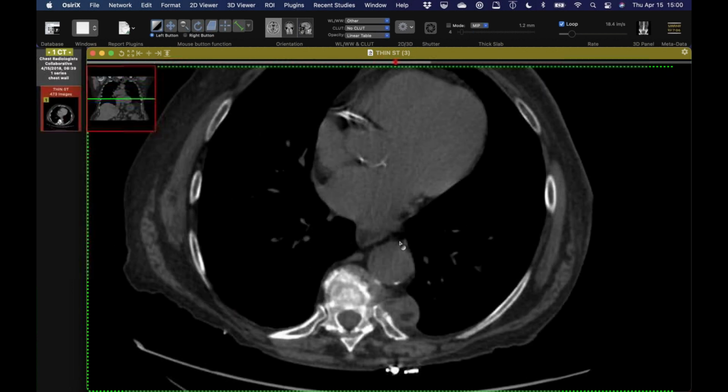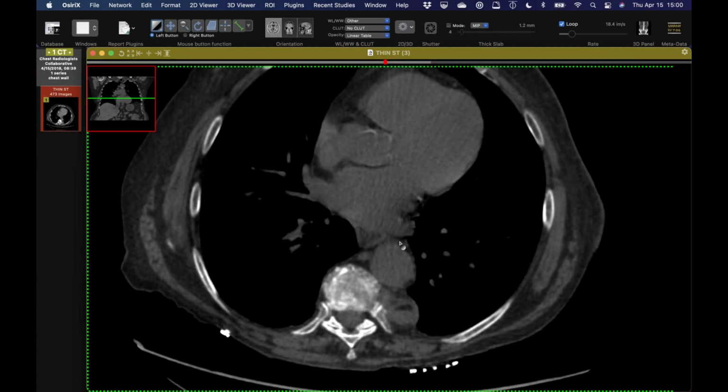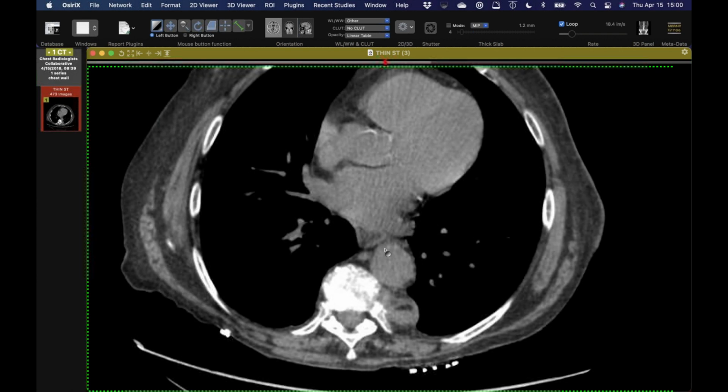I think they're sending off the new extended myositis panel that has some other things. Because I showed my residents a case yesterday that was an anti-synthetase syndrome that had a very similar type. It looked UIP-ish, but it had the exuberant honeycombing. How old is the patient now, Jeff? He is, I want to say he's about 64, so he would have been in his early 60s. Wow. So it's kind of at the lower end of your typical IPF patient. Right. So that's another thing. And I don't think he had a smoking history, which is also kind of another strike against IPF.